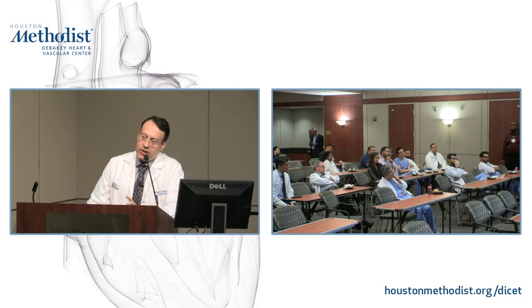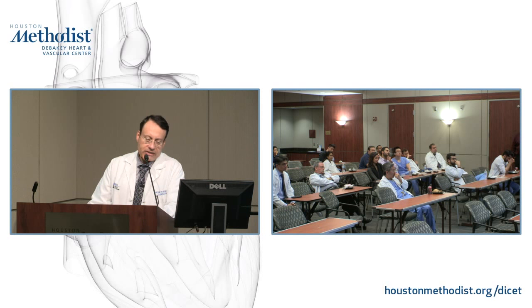But there is nothing contracting in the pulmonary veins, so it's easier for the LA to send the blood back into the vein. Because the atrium is contracting forcefully, trying to deal with this increased afterload, the atrial reversal is of a higher amplitude, and the ejection from the atrium into the vein will last longer than the ejection from the atrium into the ventricle.